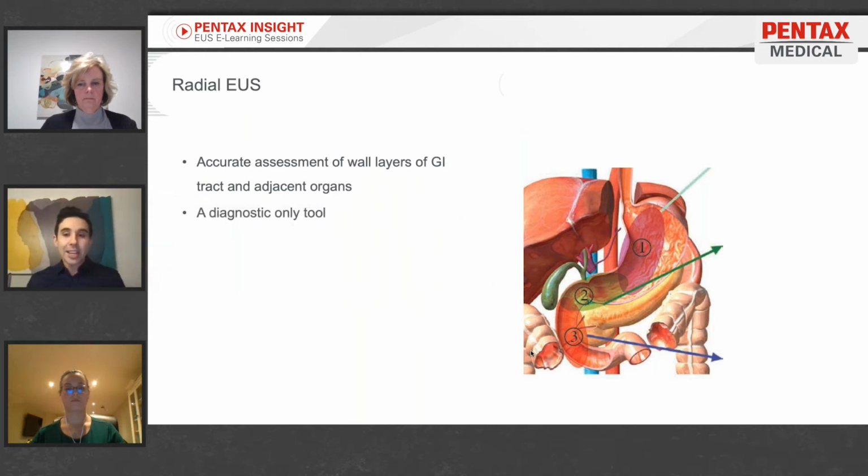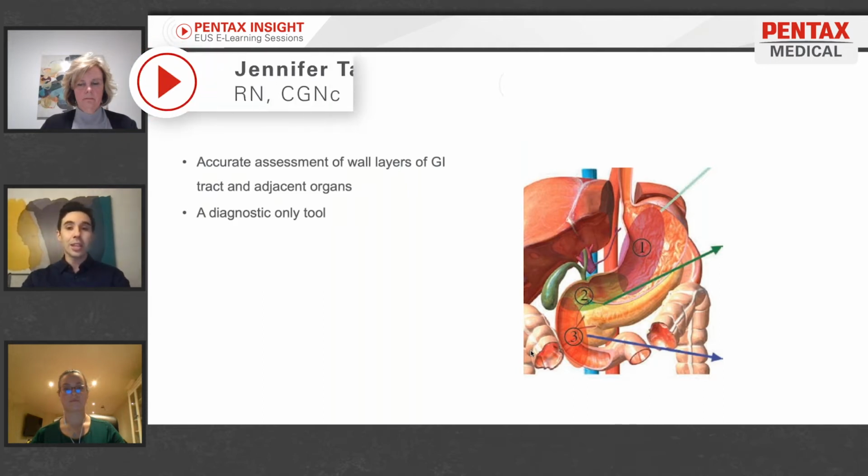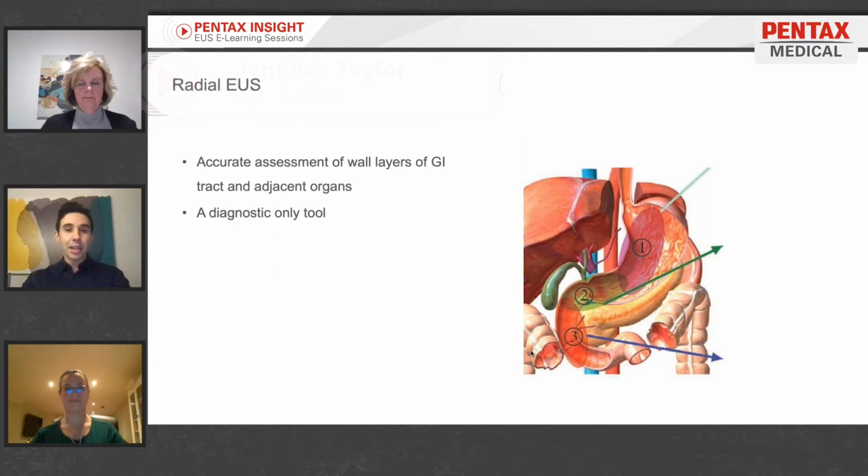Well, the thing that is static in everybody is blood vessels. So whether or not somebody has a small pancreas or an absent gallbladder or two kidneys or a horseshoe kidney, I know that everybody has an aorta. I know that everybody has an IVC. I know that everybody has a portal vein and a splenic vein, within reason, of course. And I know generally where all of those things are, and they don't deviate very much in the average population. Those things aren't going to deviate. And so we rely on our vascular anatomy to then help guide what should be around those vascular structures.